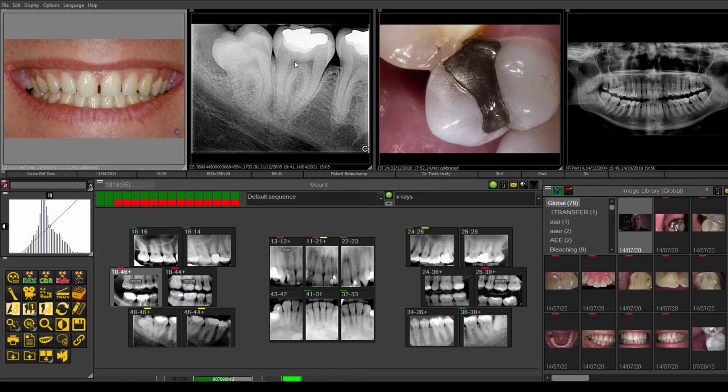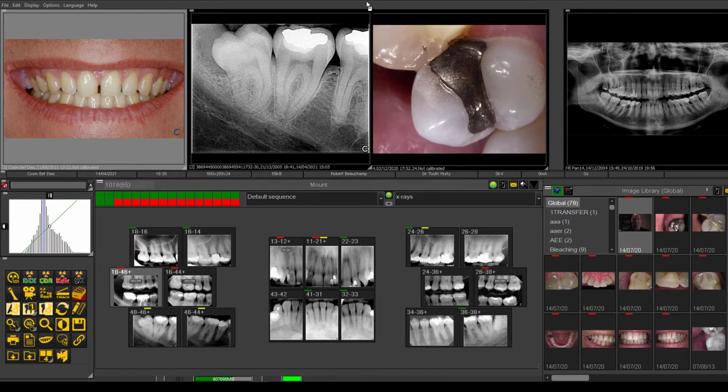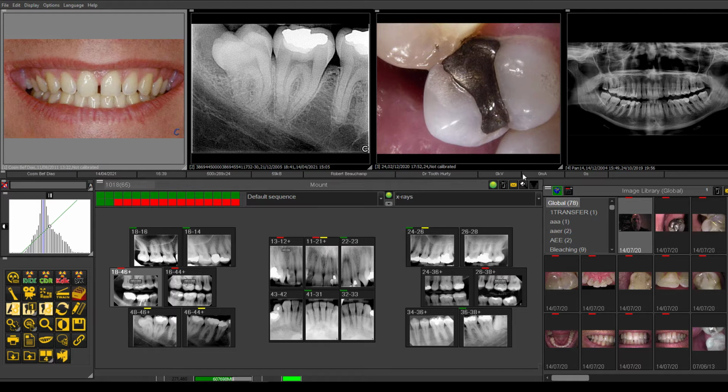screen currently. So if you wanted to change this layout in any way, you can just grab any of the windows and move them around and place them anywhere you'd like. And you can change the size of a window as well. Okay? So if you would like to add a window, you can add a window or a viewport. You can move any of these windows around as well. So this is where you can activate tools on the screen also.